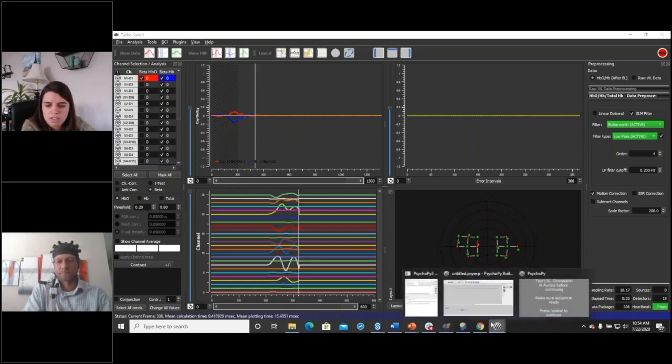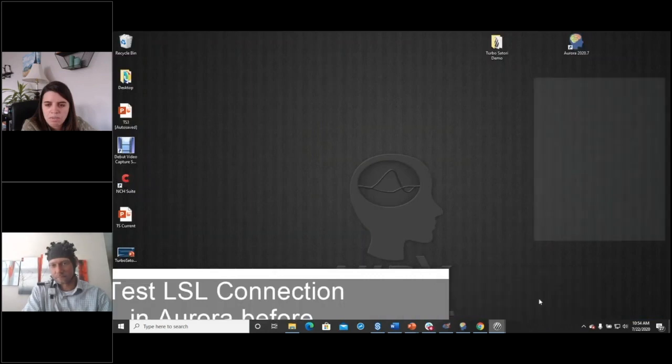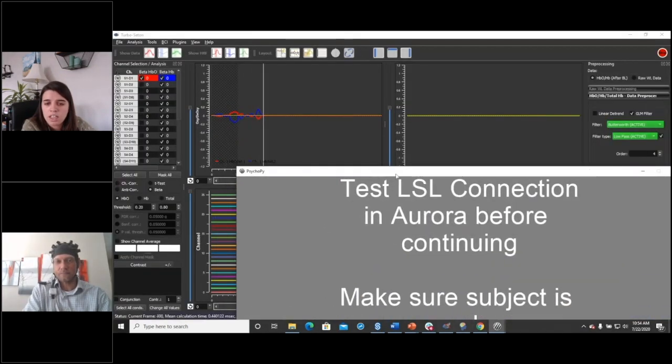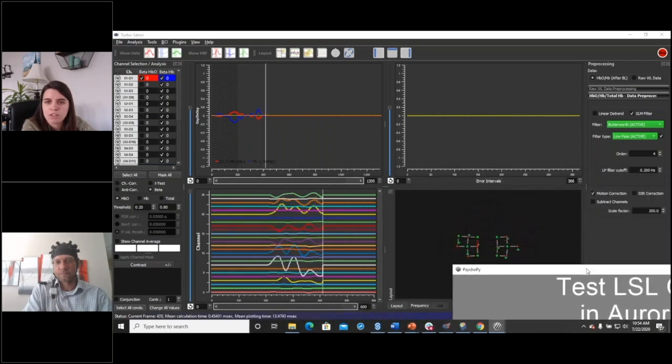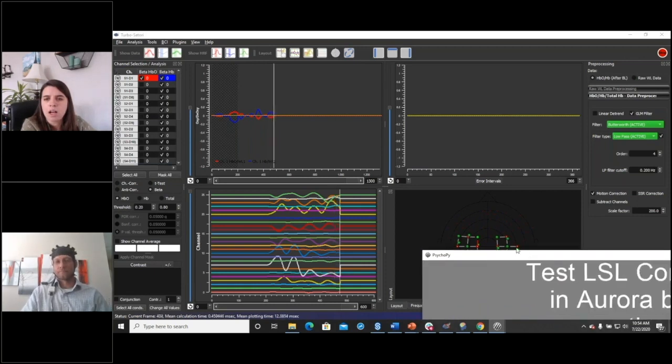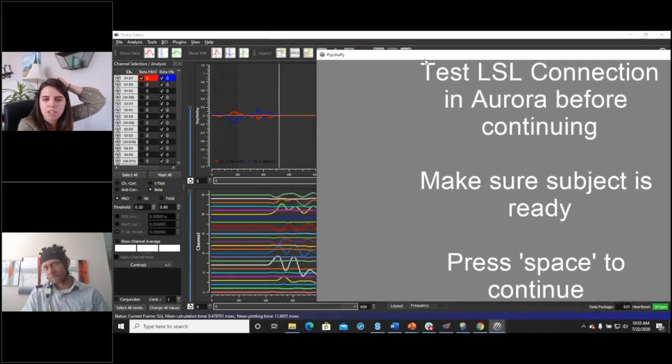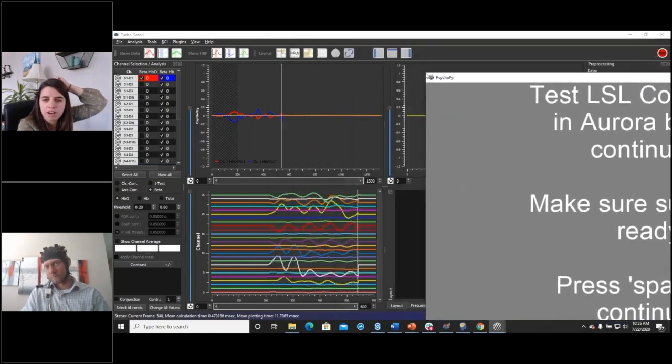So Eric, I'm going to hit start. And you'll be able to hear the prompts, correct? So I don't have to show them on the screen. Eric? I think Eric might have trouble hearing me right now with PsychoPy, but not to worry, we'll keep this going in the background.